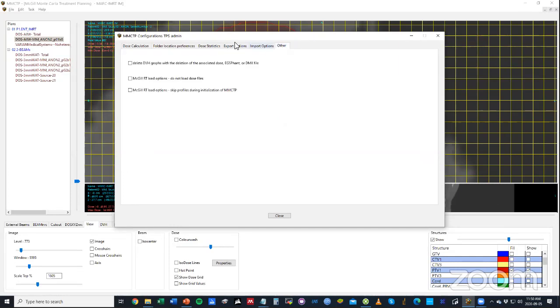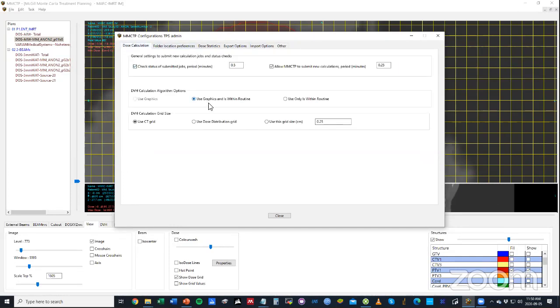A few things that I see on my version different than yours is, for example, when you point your mouse into the images, you actually get a dose value recorded. I don't get that. It's not there. That's interesting how there are so many differences between the different platforms. Yeah, and so I don't know why. Either I'm using an older version, but I believe that's some fundamental things you took care of. I'm sure about that. Yeah, it should be working appropriately.